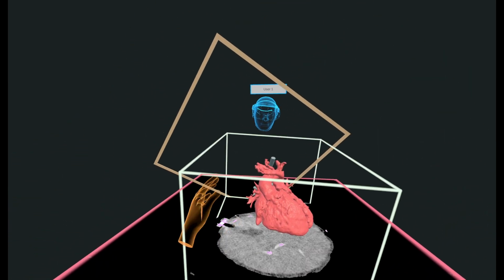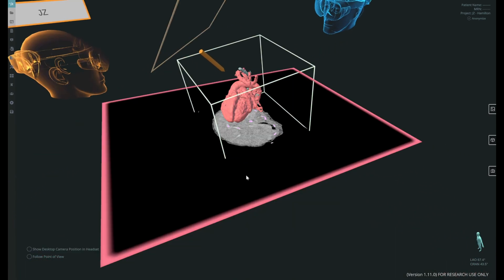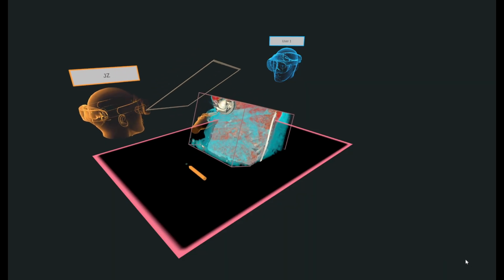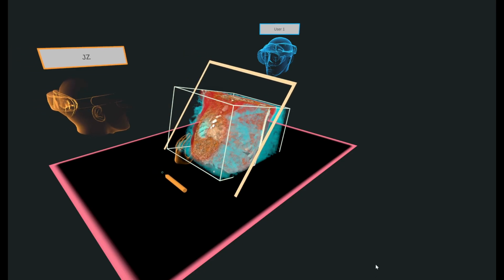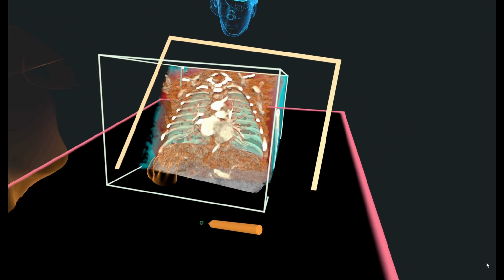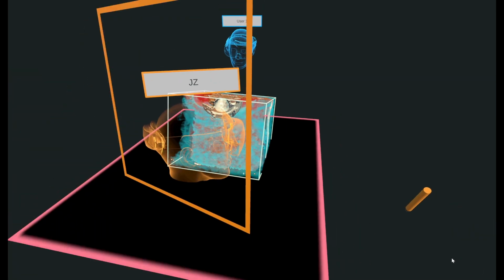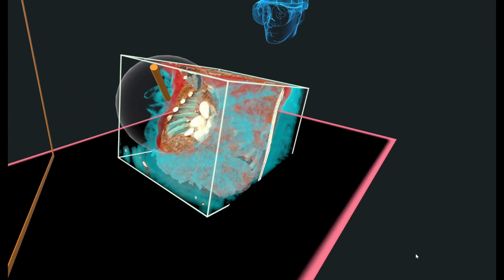An easier way to do this is if we actually have a volumetric, so we can hide all this and go to a volume rendering. This is a very nice tool when it says full, because we can have a lot of the airway and lungs as well. I'm going to crop through just to show that. You can see the lungs, and then we'll be able to see the airway in this same segmentation. We can change the contrast and see more. Or instead of using this, we can do the clip sphere, which I liked, as you can make it as big as you need and just go to the area of interest.